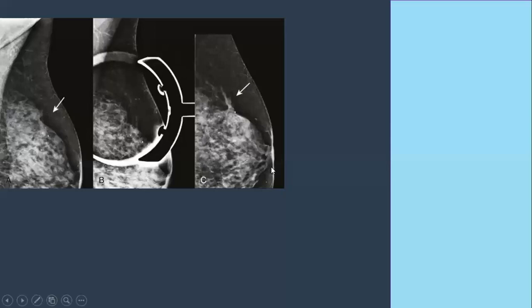I think this is a different view, it looks like a straight lateral, showing radiating lines. The difference in the view, it looks probably like a 90-degree lateral view, demonstrating more distortion. But I don't see the CC view. Most likely it is a single-view distortion, not seen in the other standard view.